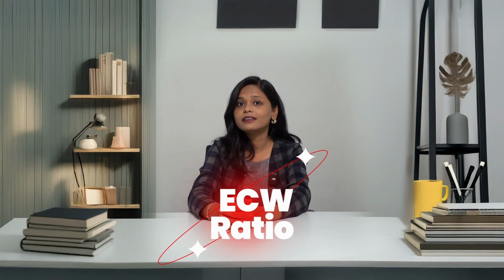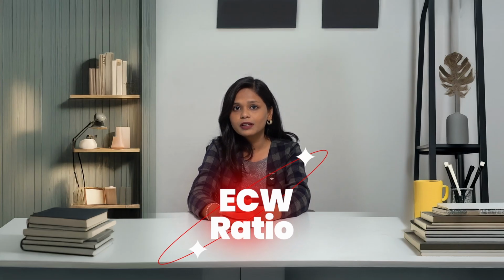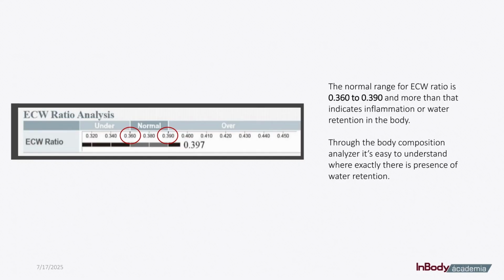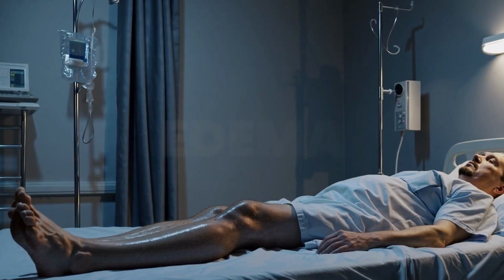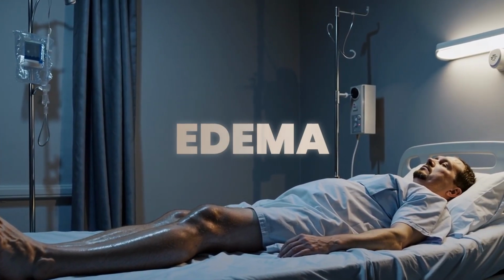Now, let's talk about a very interesting parameter, the ECW ratio. InBody can measure if there is any fluid retention or swelling in the body with a simple parameter called the ECW ratio. The normal range for the ECW ratio is 0.360 to 0.390. In case someone has a higher ECW ratio than 0.390, then there can be a little bit of fluid accumulation in the body. This can eventually lead to edema. So that's why it's very important to detect if there is any fluid retention or swelling in the body through this ECW ratio.